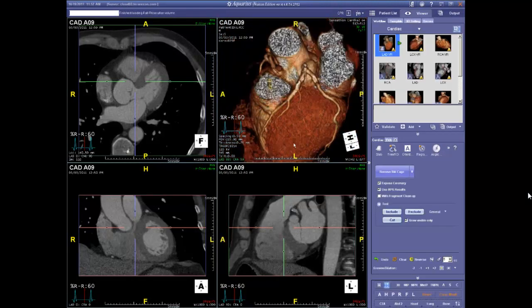And we first come to this space here, which is a typical rendering that you will see on a workstation, either if it's local to your work environment or if it's remotely accessed, as we're doing today. But we really have a 4-panel screen which illustrates color and grayscale renderings of this particular individual, who was about a 39-year-old male who had smoked and had risk factors established and had chest pains which were atypical.